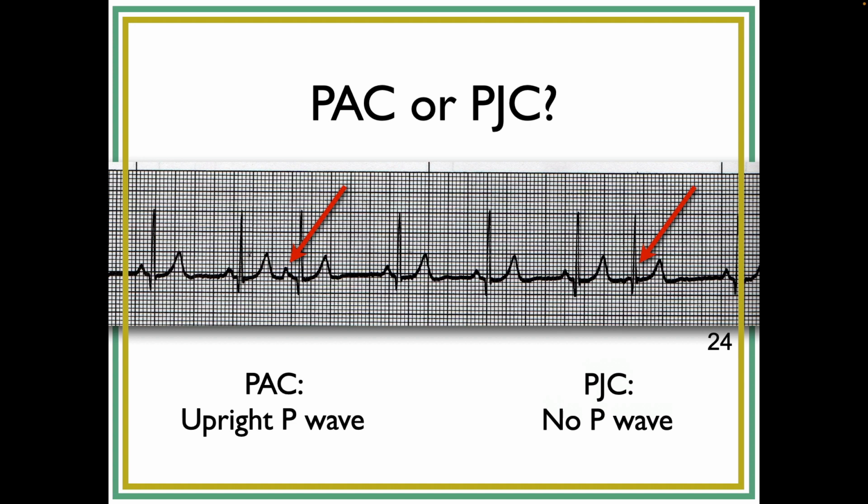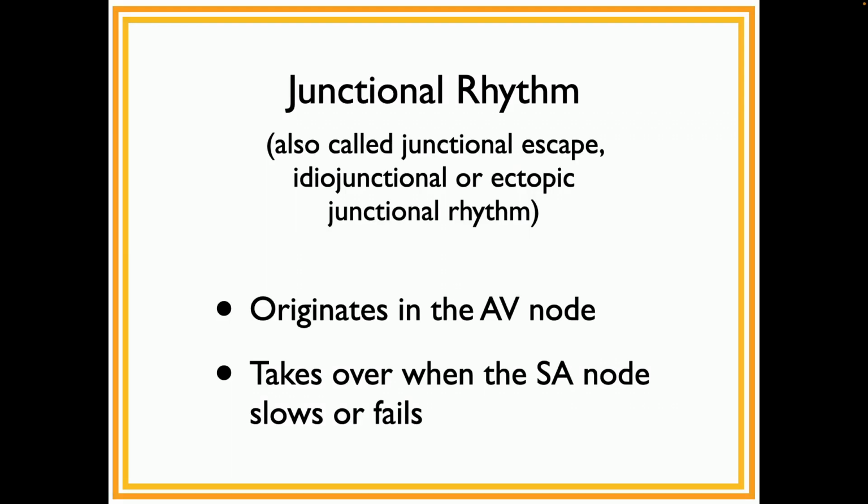Okay. And again, just to be clear, I'm not sure, but I don't think you're going to be spending a lot of your internship talking about is it PAC or PJC. It's simply not, clinically, it's insignificant. In fact, to be honest, the PAC and the PJC typically, unless there's a whole bunch of them, is not clinically significant either. Okay. But still, you need to know it. That's why I look at the app. Okay.